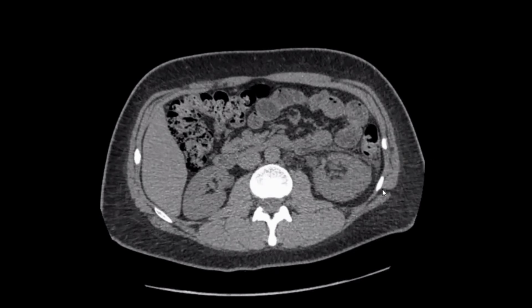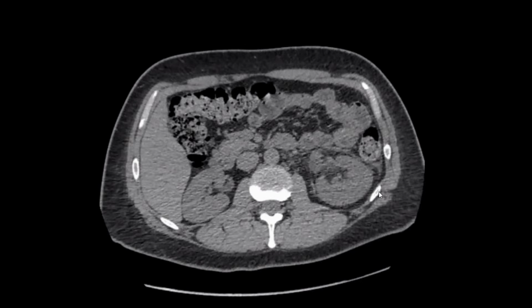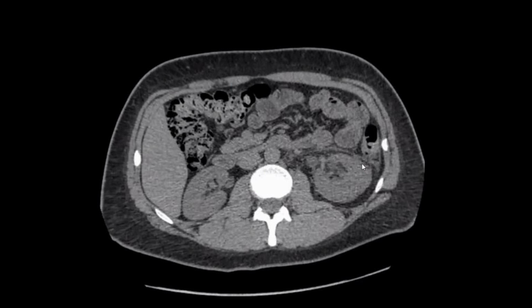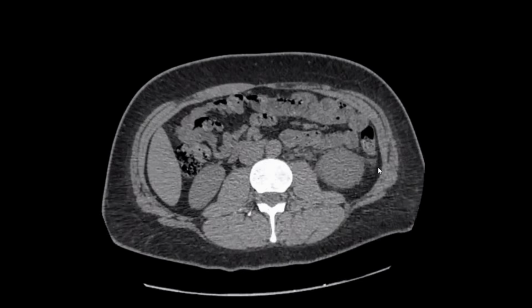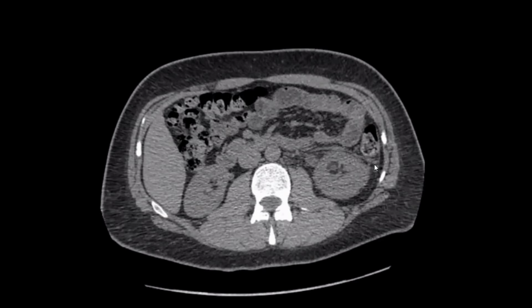As we said before, the renal fascia, either anterior or posterior, is not one layer, but multiple layers, a multilaminated layer. Sometimes these layers are expanded by free fluid collection. As you can see here, this minimal fluid collection is expanding the anterior renal fascia. Once we have an expanded anterior renal fascia, we can call it the retromesenteric plane.